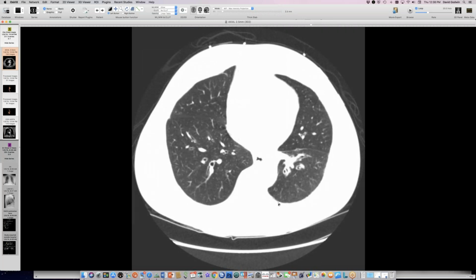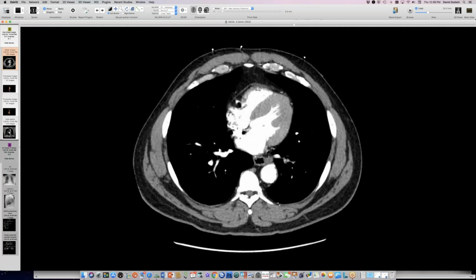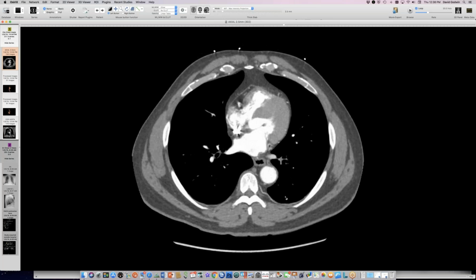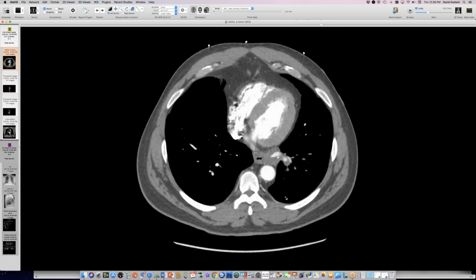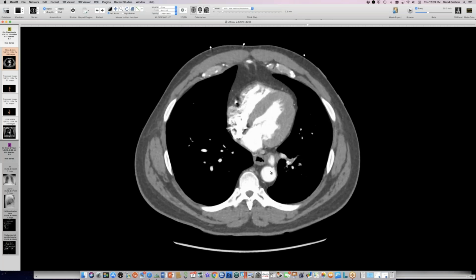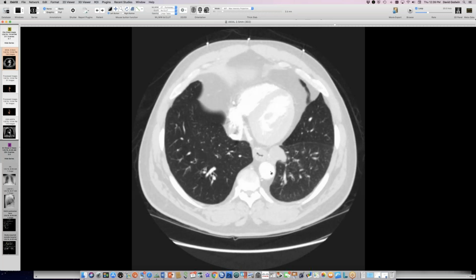So that goes with this. This lesion was resected, and they're calling it a sequestration. It's got a congenital systemic artery going to it. This is not acquired neovascularity, a la chronic inflammation. This is clearly a congenitally abnormal artery coming off the aorta. It's very large for the size of the lung that is getting the perfusion.